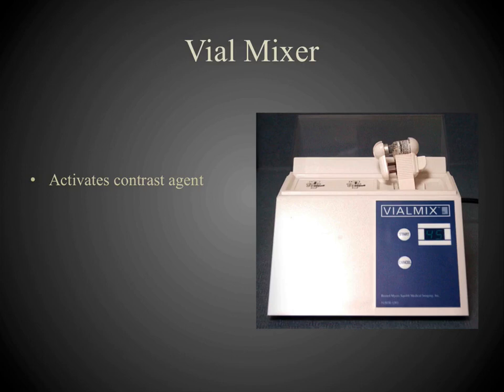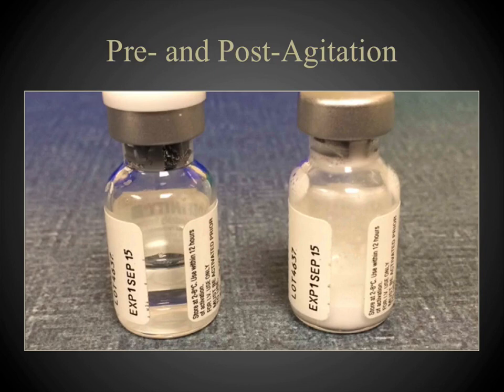The perfluorocarbon microbubble of Definity is activated by use of a Vial Mixer. After agitation for 45 seconds, the volume of contrast increases from 1.2 to 1.8 milliliters and turns a milky white color. The microbubbles are stable for the duration of the procedure.